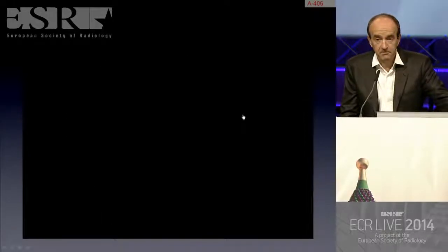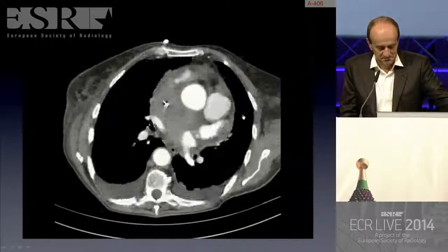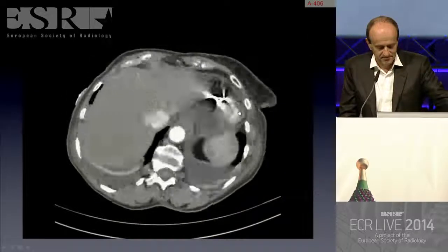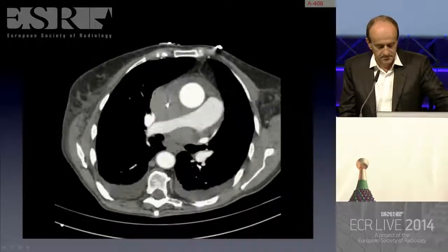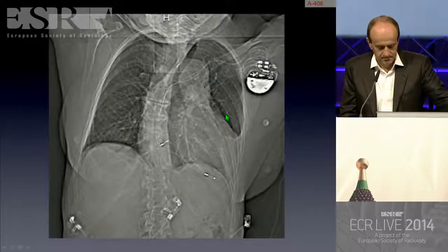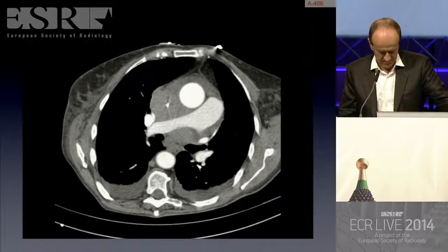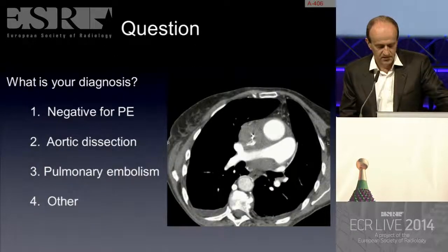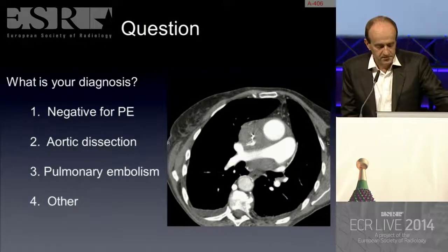It's clear for everybody? Well, what is your diagnosis? Negative for PE, aortic dissection, pulmonary embolism, or other? Please vote now.